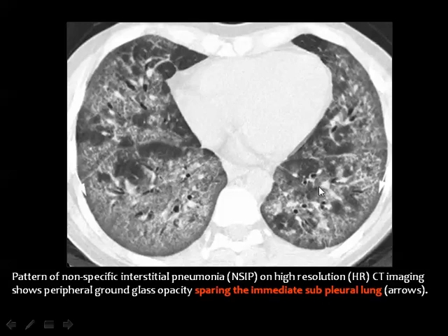But in the recent classification, it is allowed that the bronchus is normal even if it is 1.5 times the adjacent vessel. But if it is double the size of the vessel, then you have traction bronchiectasis. It is better to assess the dilated bronchi along longitudinally oriented sections, not cross sections. Okay.